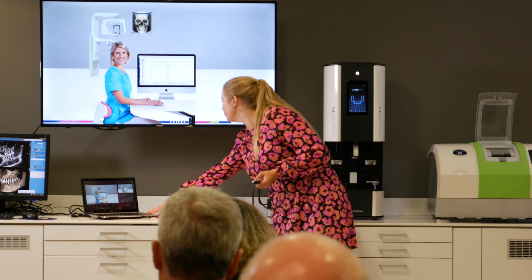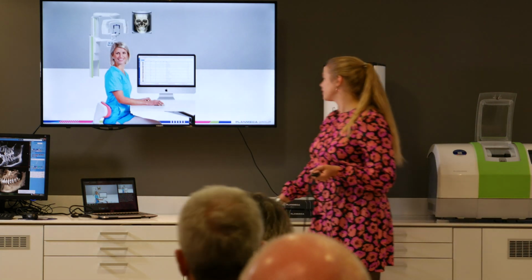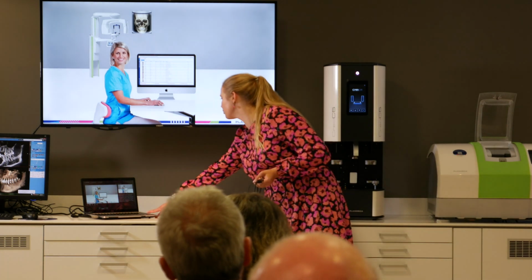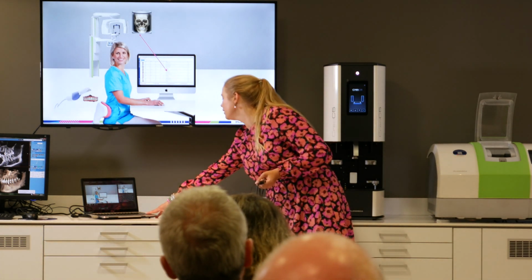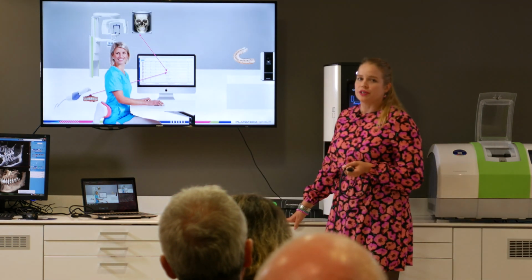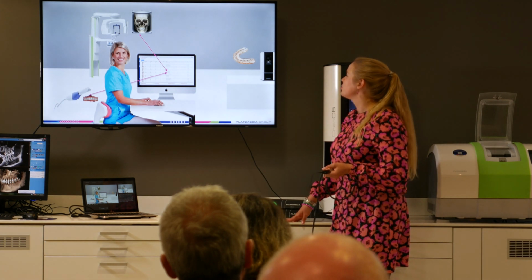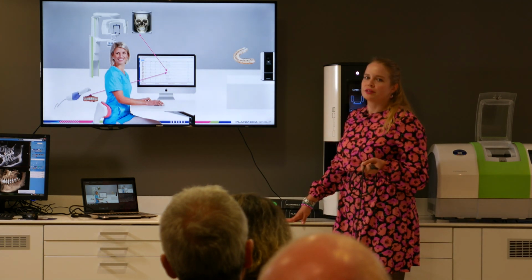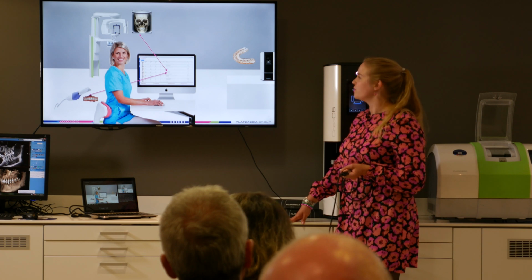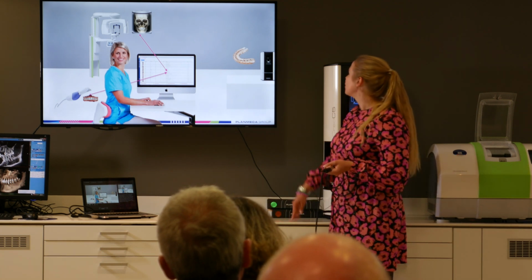And then if we move on to something still more advanced, our latest addition to Romexis 3D functionality, we could even plan orthognathic surgeries. So if orthodontic treatment is not enough, we could do orthognathic surgery by cutting both or one of the patient's jaws and moving that to a new position.